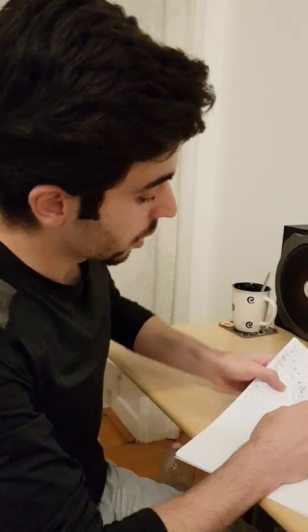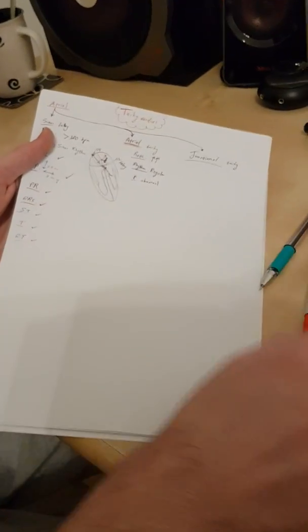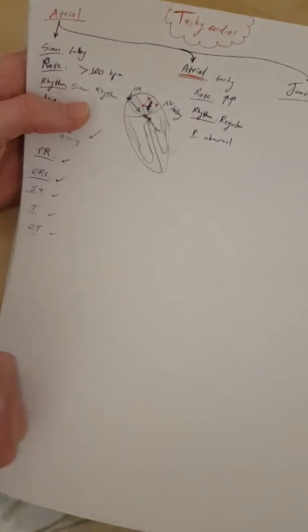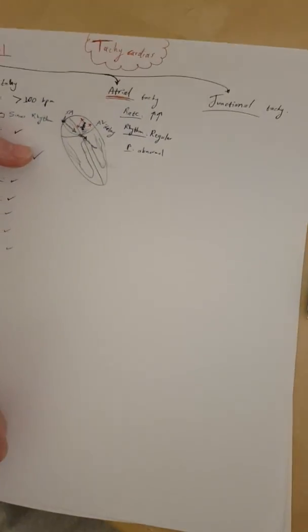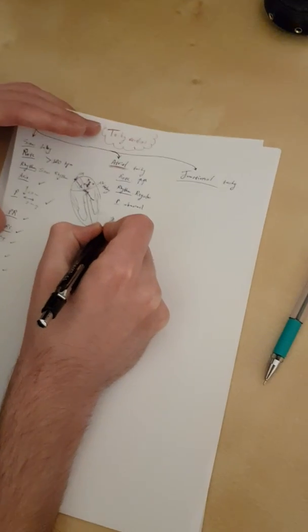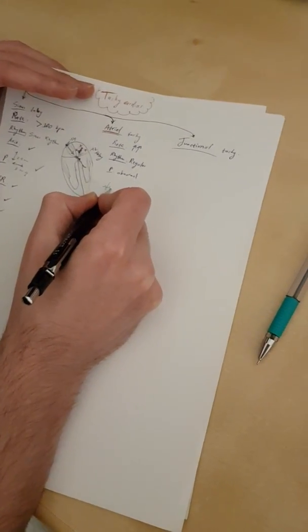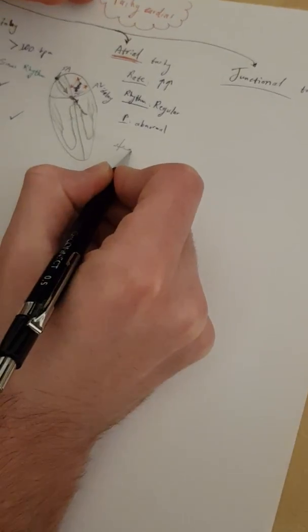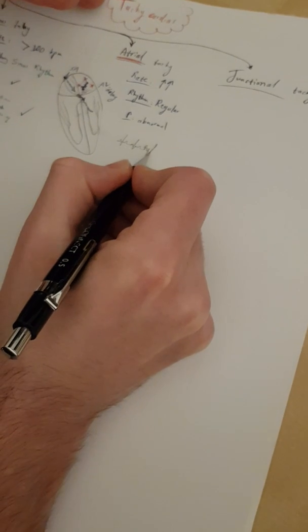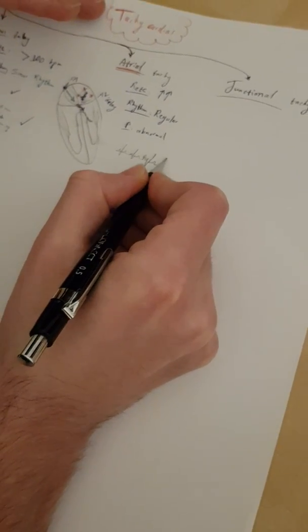Or for example, it can be that there isn't just one focus, but actually there might be more than one focus. Here the star and the X and so on giving you. So it can be, for example, multifocal. Okay? So in this case, what would you see on an ECG? You'll see something like here's a P wave, and then QRS, doesn't matter really, T. Then you'll see another P wave, QRS, and then a T, and then you'll see another P wave, and then QRS, and then a T, and then you'll see a P, QRS, and T.